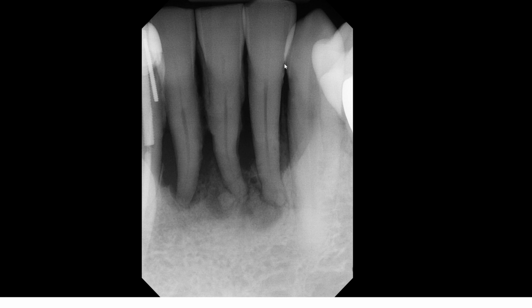Additionally, if you look at the incisors, I think I should have mentioned that on the previous radiograph, but you don't see any major sign of large restoration or dental caries, but rather just a lot of calculus deposits along the root surface. So let's go back to the other one more time. Again, there's some signs of attrition. However, no sign of caries.